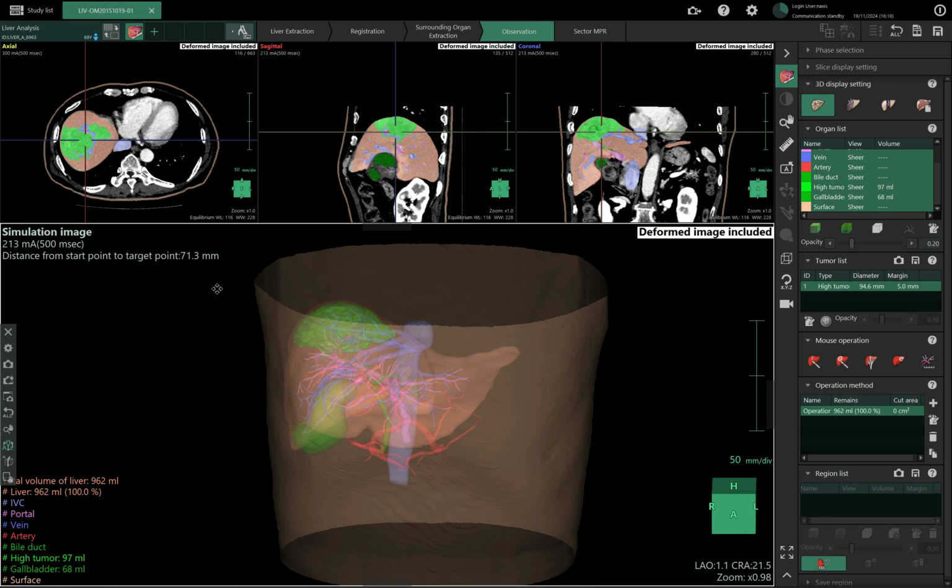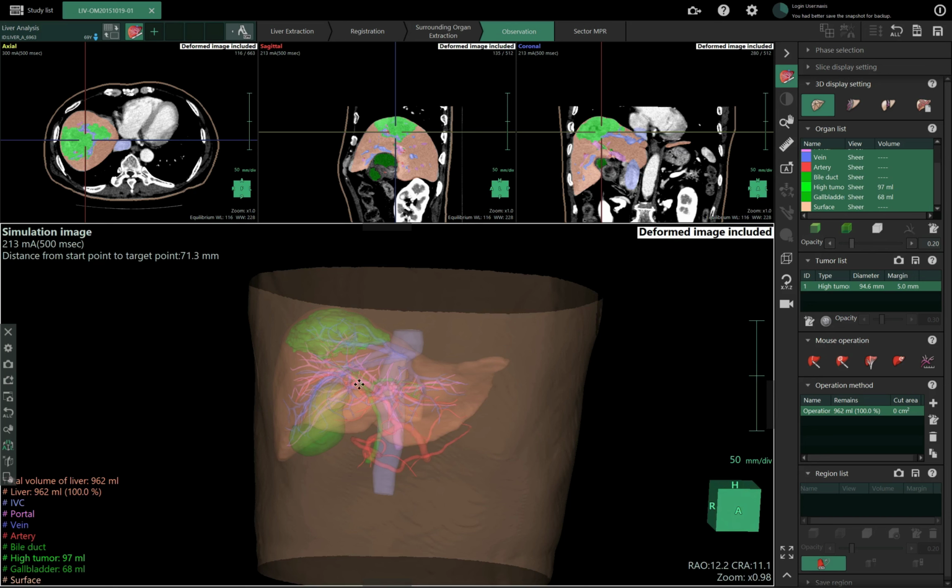And one thing we do quite automatically, and they do love, is extracting the segmentations of the portions of the liver. This is something they really like, and of course some cases are complicated, because the porta has some malformations or whatever, and the segmentations may be crazy.